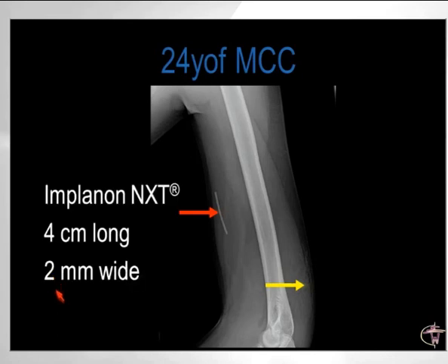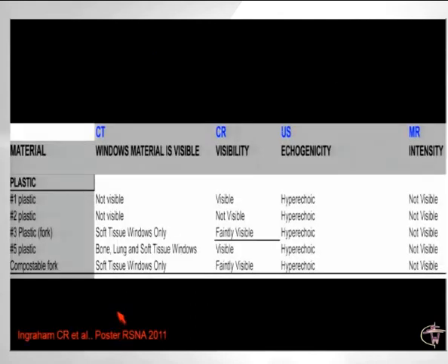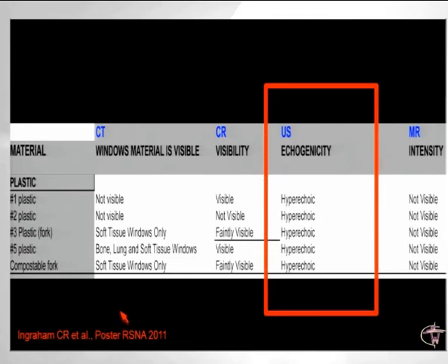It has been placed by a healthcare provider for long-term contraception. And nicely, the manufacturer has included a small amount of barium into the carrier material of this thing so that it is more visible on radiographs. When you know where your plastic is, you'll find it with ultrasound.